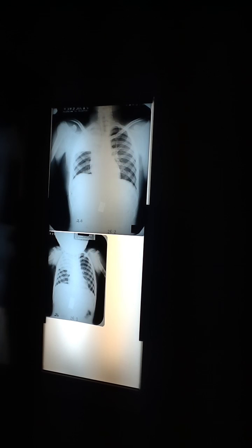Is the lung hyperlucent? Is it more radiolucent? No. Or did it move toward water density? It moved toward water density. So our ratio of air versus soft tissue swung which way? Toward soft tissue. Which means we must have less of what?